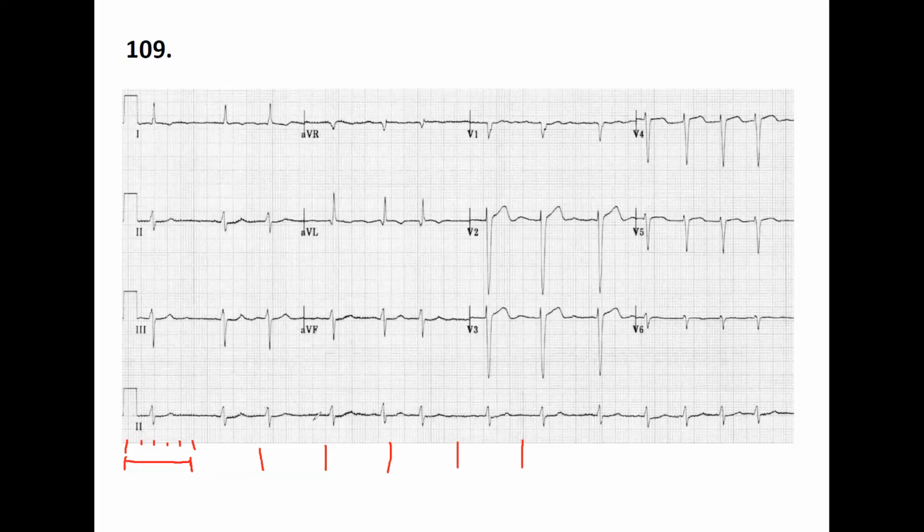So what can be the diagnosis? Arrhythmia, no P wave? Anybody? Atrial fibrillation. Correct. AFib. That's it. This is what you should remember. It's a very common type of arrhythmia, and you will face this one. And you can fail on this one very easily. But the biggest problem in atrial fibrillation is the coagulation problem. Okay, and the patient can die easily.